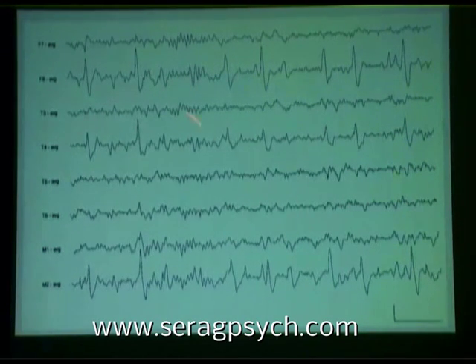And if you have a widespread abnormality, like in a spike and wave or something like that, it will contribute to the potentials picked up as the average reference, and therefore you will get a very complicated thing because you won't know whether what you see is coming from input 1 or input 2. But when the discharge is very focal, as it is here, then you're very, very certain that input 1 is creating this waveform and not input 2.